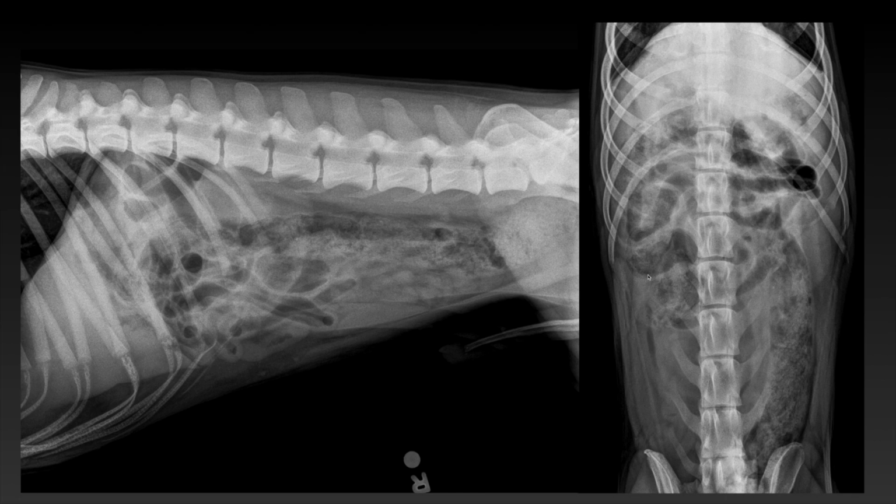And this material might be located in the cecum, but it's difficult to say only from this view. I don't have the impression that this granular material is present in small intestines in this projection, but to be honest, this could be cecum, but I cannot exclude for sure that this is not a dilated small intestinal loop.